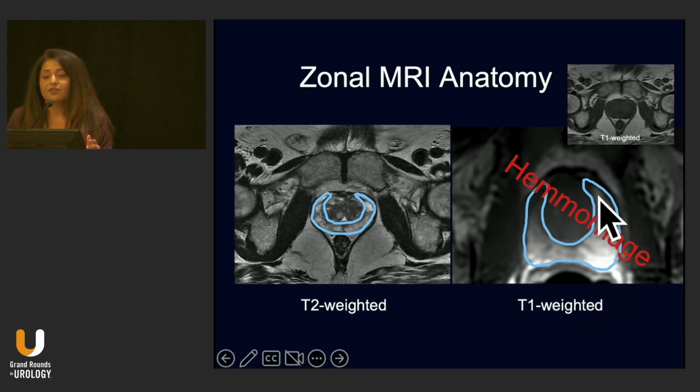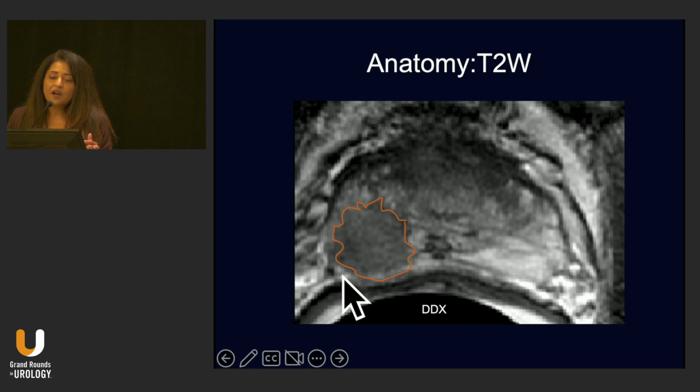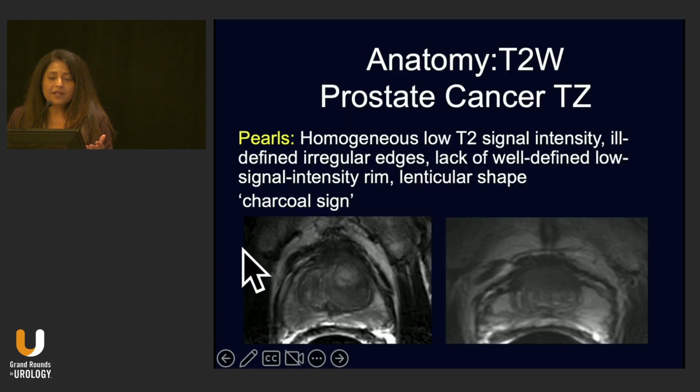We got to make sure that we evaluate if there's hemorrhage. Obviously, the hemorrhage is not so extensive usually. It's usually more patchy in certain areas. But then when you see something like that, diffusion is not so accurate. And so that's something that we need to evaluate on a multiparametric exam. Obviously, a large mass like this is not a problem. But there's a differential for that as well. But on the pathology, you can see this is cancer.